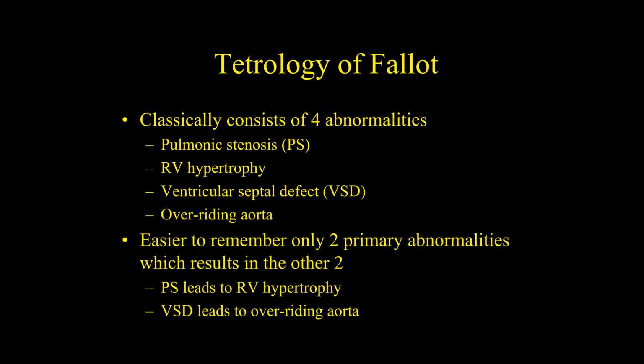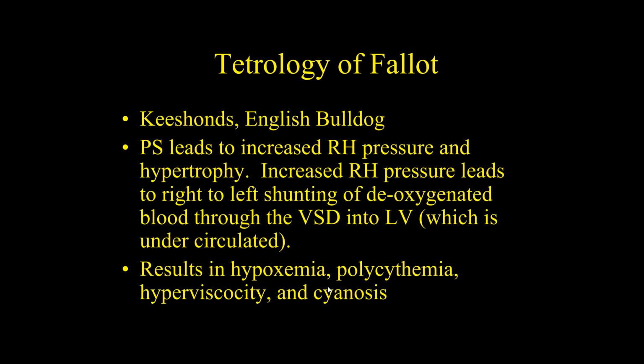complicated, I would guess. So if we look at this, tetralogies are pretty common in Keeshonds and Bulldogs. I mean, Bulldogs are your best friend because they will make you a lot of money in your practice because they're congenital nightmares, right? But this is pretty common in these. It can happen in any dog, but pretty common in these.